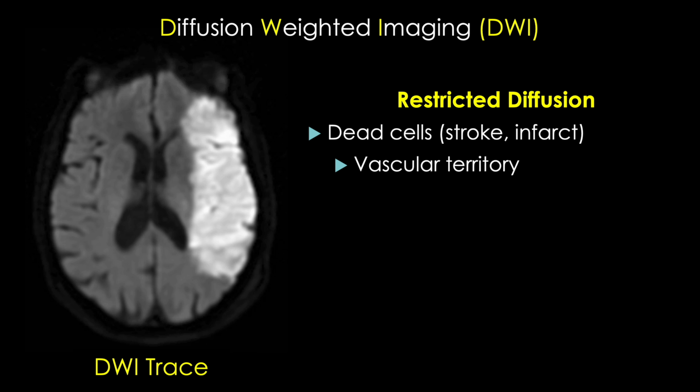Be aware that there are things other than blood clots that can do this, such as atherosclerotic calcifications that break off, as well as air if accidentally introduced into the circulation. We refer to these under the more generic term embolus, or emboli if more than one, meaning something that's traveled through the vessels and gets lodged in an artery or vein.